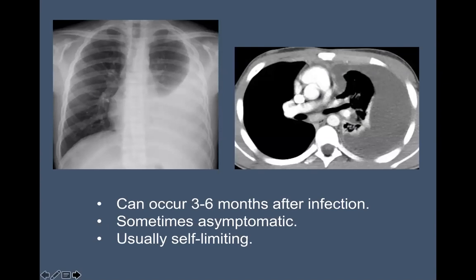And so we tend to see these pleural effusions as a little bit of a later finding, and it's not unusual for them to be completely asymptomatic in these patients, even when they're quite prominent. So they can be very alarming. If you have a unilateral pleural effusion, of course, your first thought in a child is always bacterial pneumonia. But if you can actually see lymphadenopathy in the chest, then that's going to help you to narrow down your possibilities to possibly TB, as we have with these subcarinal nodes in this young child, which you would never guess from your chest x-ray.